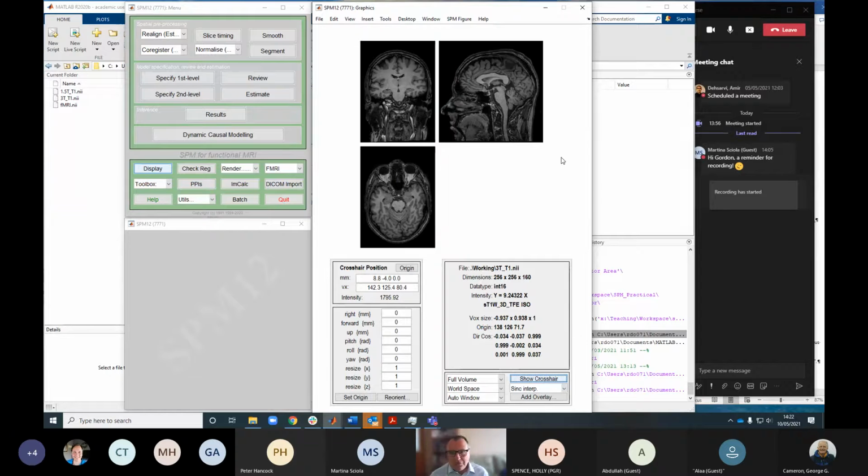That lets us see one picture, lets us check our orientations, lets us check our dimensions. You might have noticed down here that this image has a negative voxel size in the X direction. Here, a negative voxel size means that the data is sampled in the opposite direction.